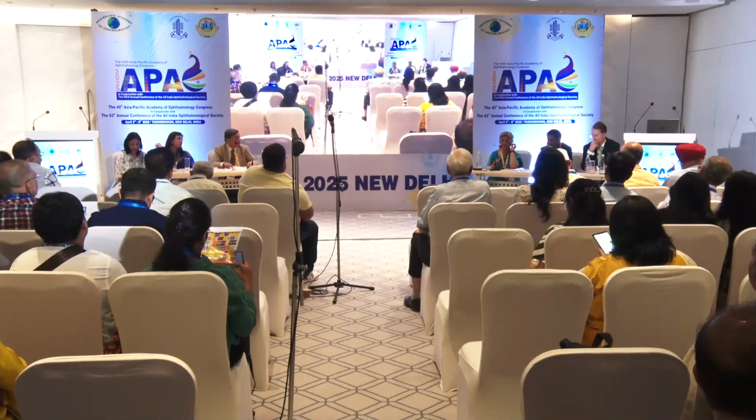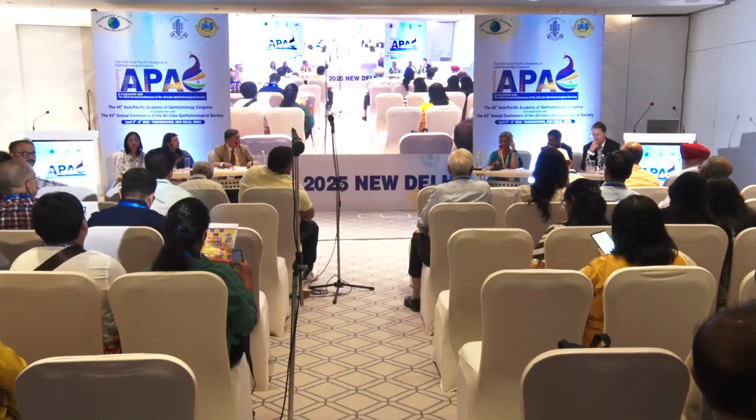And I would like to say that first of all, when we are looking at the TSNIT graph, that's a very important part of the OCT, which we definitely would like to see. So the TSNIT graph shows us, first of all, that there is a superior hump. After that, it comes down. And then again, there is an inferior hump showing where the retinal nerve fiber layer thickness is present superiorly as well as inferiorly. Generally, it is the inferior hump which is bigger.